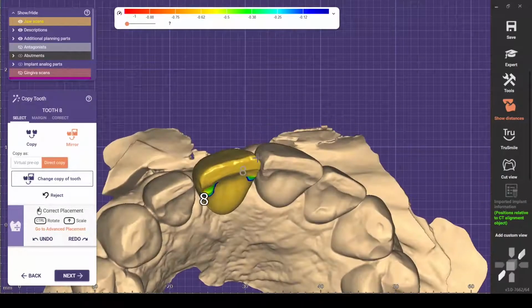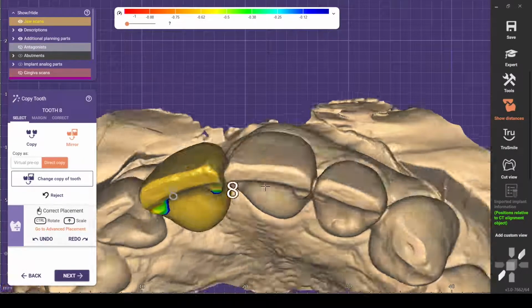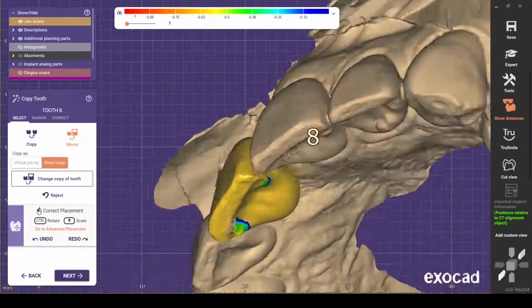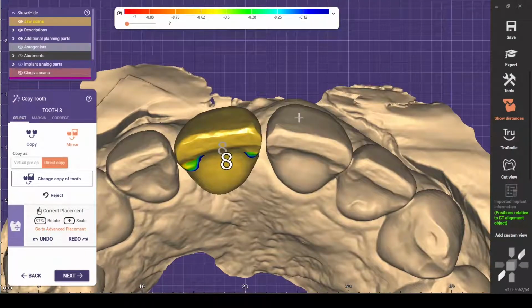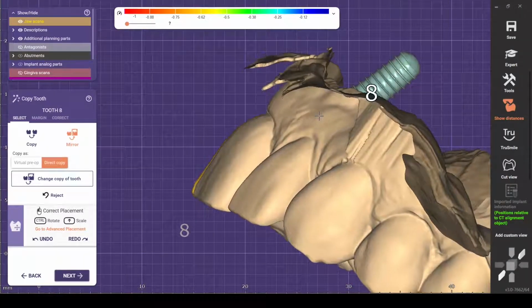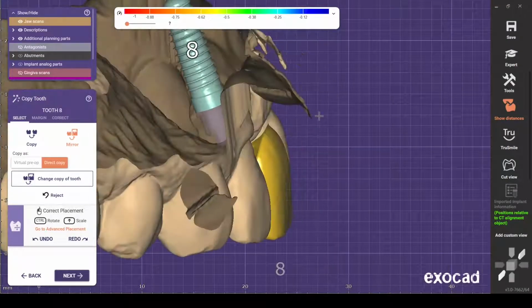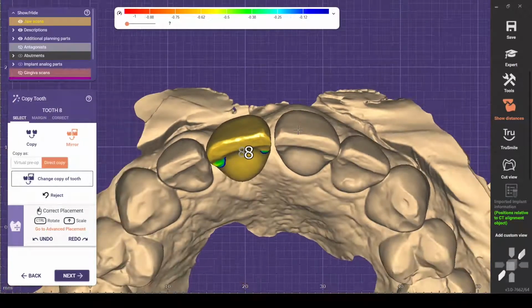Okay, that's getting there. It's getting better. Always look from the straight occlusal. Doing this number is not really helpful, so just align it to the straight occlusal so you can orient it a little bit easier for yourself. Okay, look from the side. That's looking better. Oh, love that artifact there in the scan. Probably should trim that.